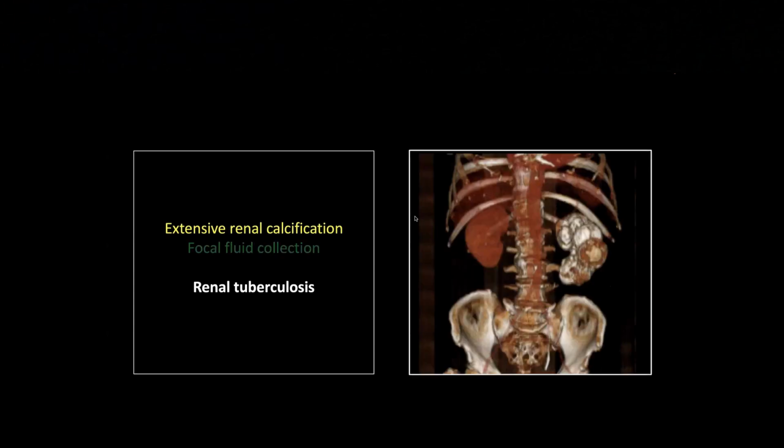So this is one of those few cases where a 3D actually helps because the whole thing is so dense. So it really gives you a sense of the extent of calcification there.